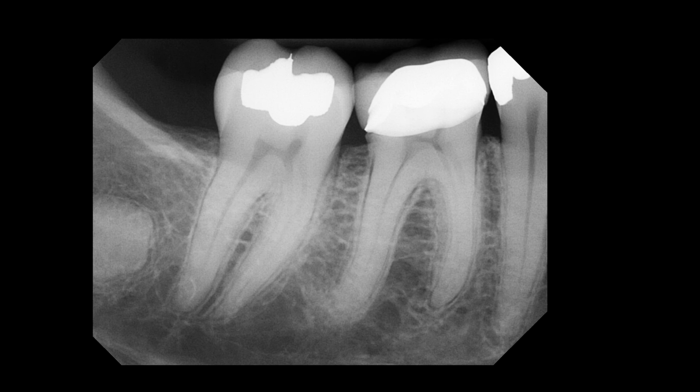So as you're looking at this, what would be your differential diagnosis? I just want to take a few minutes to walk you through my thought process as I'm reviewing this radiograph. First of all, I think you should all recognize that there is a radiopacity in the area of missing number 32.